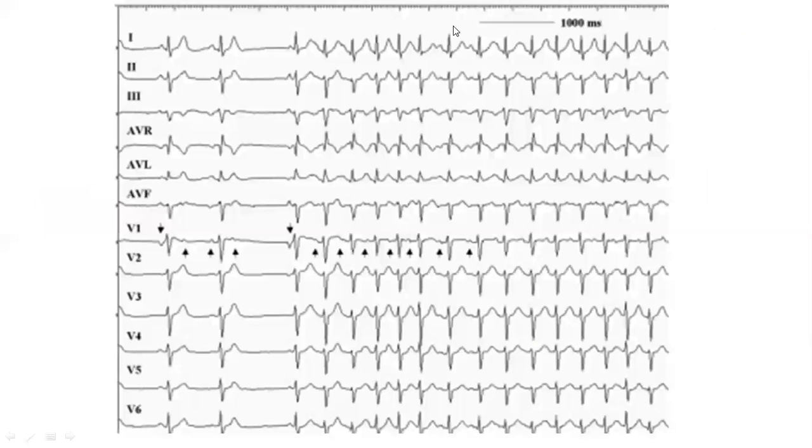In atrial tachycardia there is usually a wobble. One P wave comes, another P wave comes, the PP changes, it is slightly irregular before it becomes regular. So that change in the PP interval, which is driving the tachycardia, is called a wobble in the atrial cycle length before it becomes fixed. In re-entrant tachycardia there is no wobble. So if you look at this ECG, you have a sinus rhythm non-conducted, and you have another sinus rhythm, and then this tachycardia starts, which is slightly irregular at first and then becomes regular. So this is how an atrial tachycardia will start.